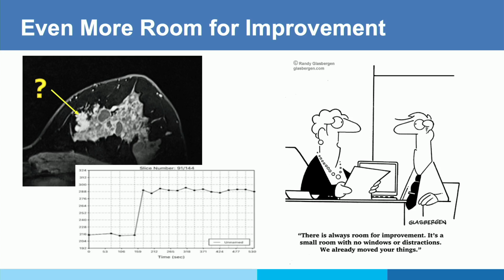Here we have a partially irregular, rapid plateau enhancing lesion. What are you going to do with that? Are you recommending biopsy? Yes, obviously you will, because there is no other parameter that can sort of bail you out. A T2 signal intensity also doesn't really mean anything here, because even if it's hyperintense on T2, I have seen so many T2 hyperintense cancers in my lifetime that I will never ever base my decision to downgrade a lesion just on that.